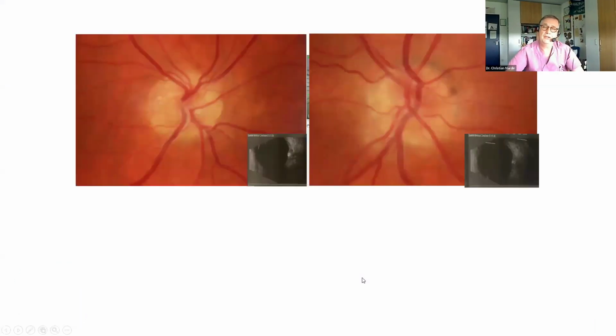Let's look at the first patient with a so-called swollen disc. This patient is rather easy because it's an elderly patient and you easily appreciate the drusen with fundoscopy already. But the workflow in many places is that you first get the OCT, you have not dilated the pupil yet, you don't get a picture of the optic disc, and then you have to interpret the OCT already, and this can sometimes be misleading.